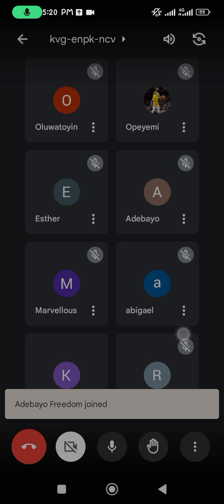But I already told you what R to R is. What is between one R and the next R? How many boxes? This is an R to R. You're going to count how many. This one is like 1, then this one is 5, that's 6, then 5, 11, then another 5, that's like 16. Then you're going to find the square root and divide both of them. That formula is called Bazett's formula for calculating the QTC.